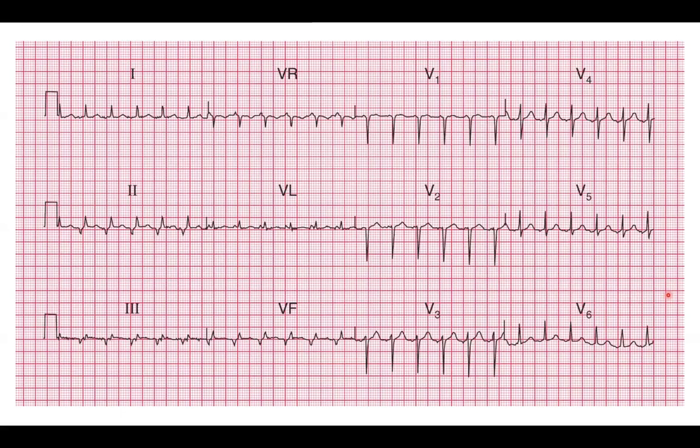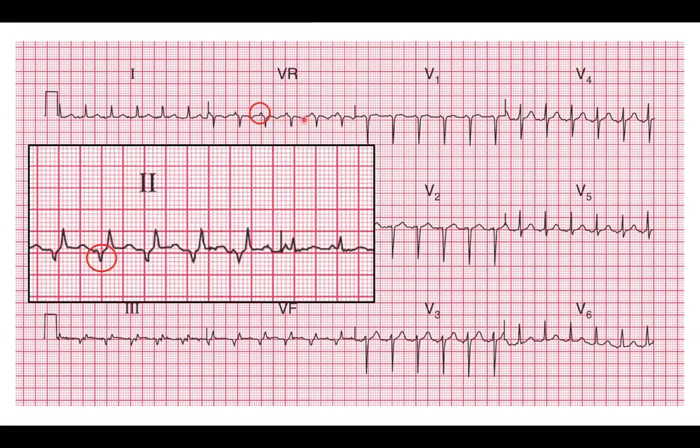All right. So just as before, we have someone going at a rate of about 150 beats per minute or so, and looks pretty regular, looks like a narrow QRS. And so we start sort of hunting for our P waves, and looking here in lead 2, we see what looks like potentially some P waves, but with an abnormal axis, right? There's down in 2. And we sort of look in AVR, we see those similar notches in an upwards direction. So again, not the typical axis we're used to.